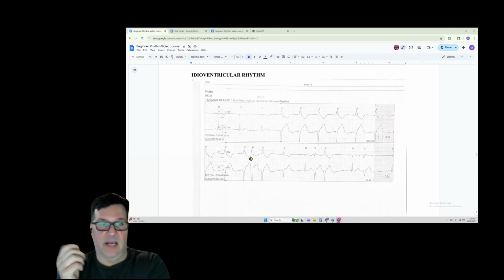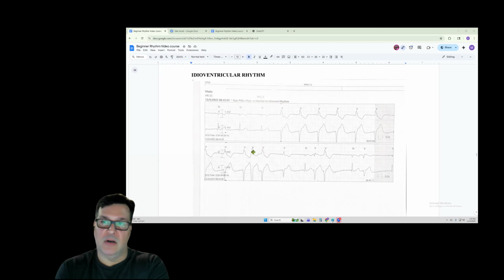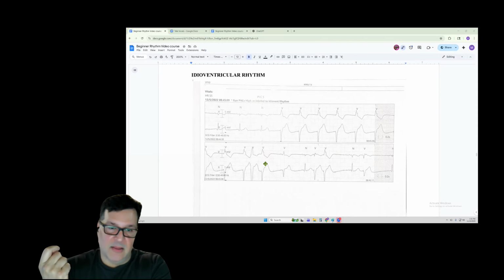So I'm just going to use this example to cover both things. Just like PACs, premature atrial contractions, and PJCs, premature junctional contractions, you have PVCs, premature ventricular contractions. Again, there's a difference between pacemaker cells and excited cells. These excited cells are excited and they just want to come first. Then you have a compensatory pause after them.